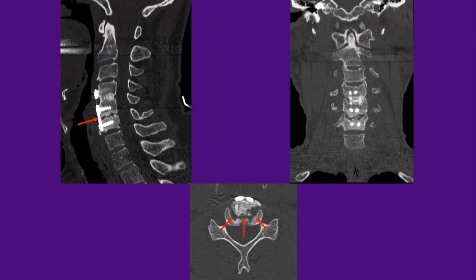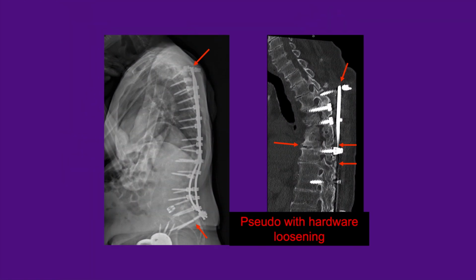And here a final case in the cervical spine with two-level ACDF where we see failure of incorporation of the interbody graft at the more inferior level, outlined by lucency. So there are forms of hardware complication that can occur at any time.